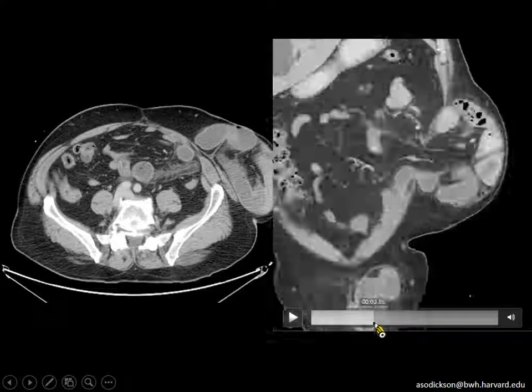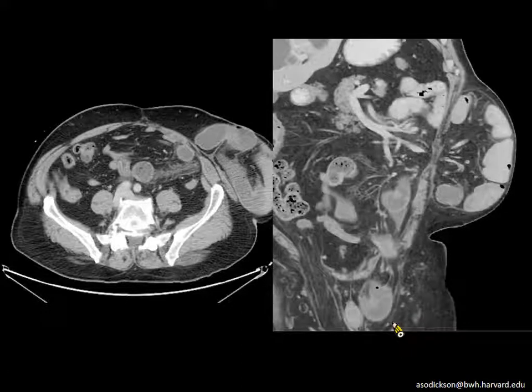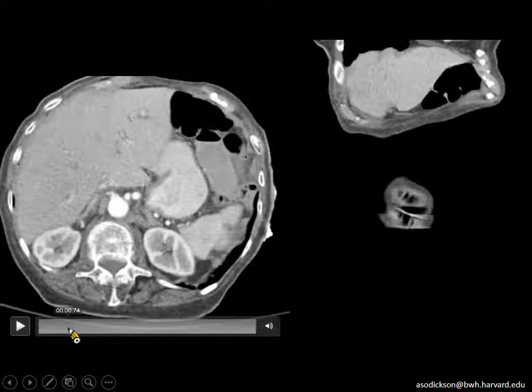These bowel obstructions with a single point of transition are often managed conservatively by our surgeons. More and more lately than at the beginning of my career, very few of these patients end up going to the operating room if their clinical exam is good and we don't see suspicious findings for bowel infarction or impending bowel infarction. So our job as radiologists is to differentiate those cases that need to go to the operating room more urgently. Let's move on to another case.